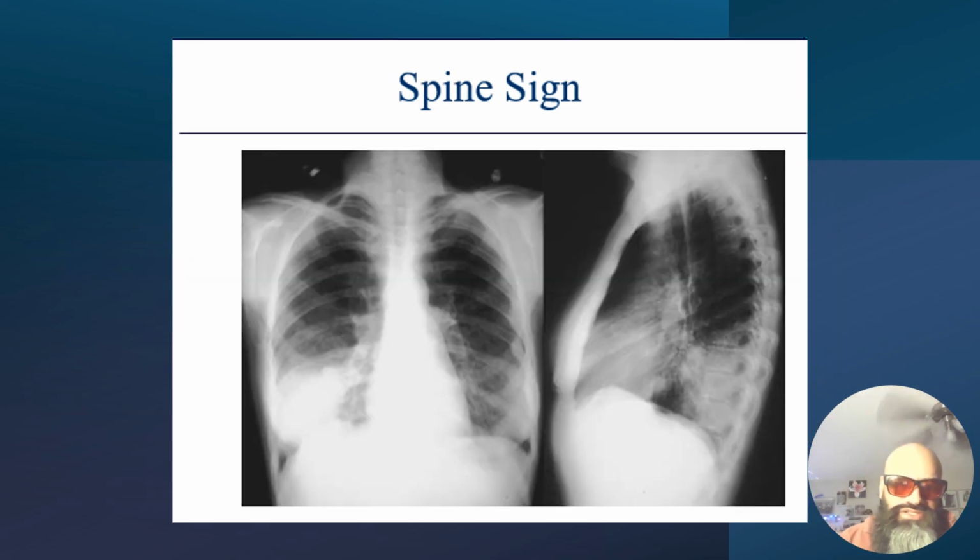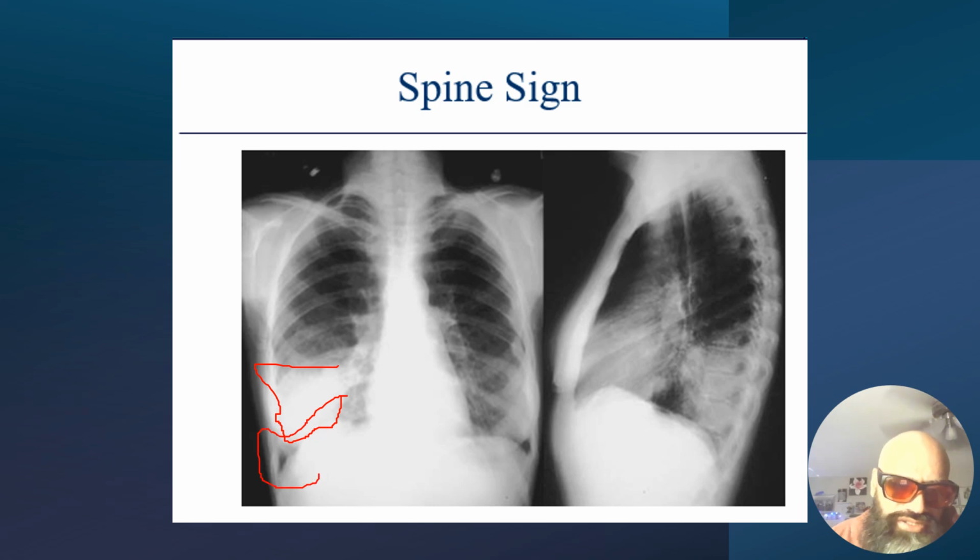Look at this image here. This is a right lower lobe fluid consolidation. You can see that the costophrenic angle is now blunted with a small area of air density in the middle. The right hemidiaphragm border is obliterated here, so that's a good silhouette sign there.